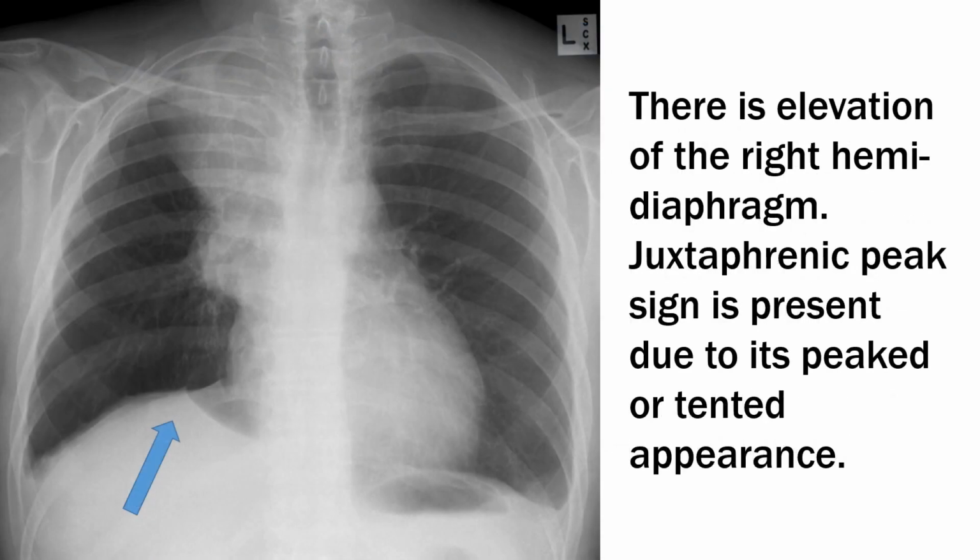In this X-ray, there is elevation of the right hemidiaphragm. Juxtaphrenic peak sign is present due to its peaked or tented appearance.